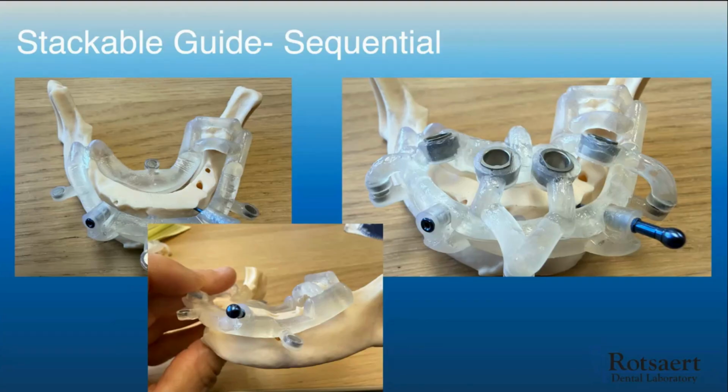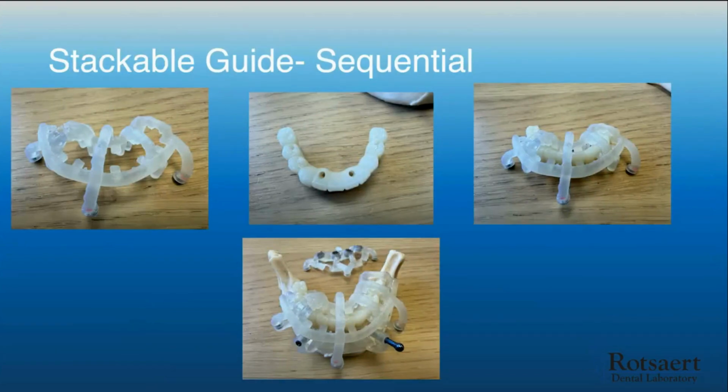You click on the surgical guide aspect where it's got the guide sleeves. But then we also have another one that clicks on, and it actually holds the temporary bridge. So you can use that to position everything and be able to lute the temporary cylinders in place. Again, like I shared before, not everything is finished. You need to do the dentistry to be able to relate them.